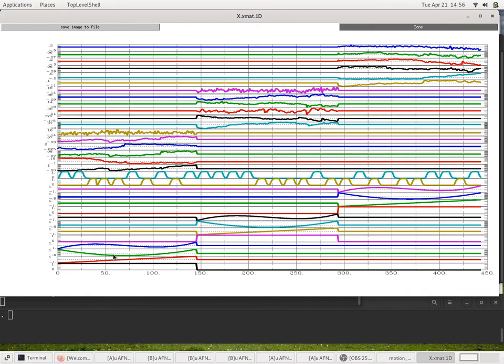So here's the constant, linear, quadratic, and cubic drift terms for run 1, and then they're all constant 0 after that. And then the same 4 terms for run 2, and then the same 4 terms for run 3. Then we have our 2 regressors of interest. I'll come back to how those are constructed. And then we have the motion parameters for run 1, run 2, and run 3.